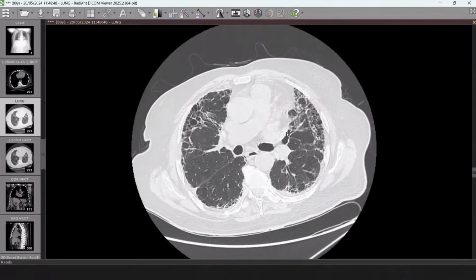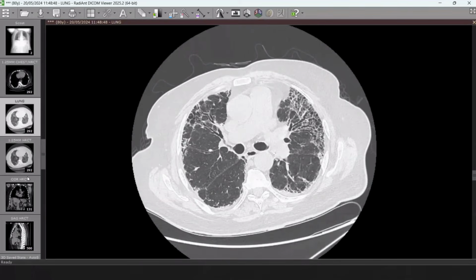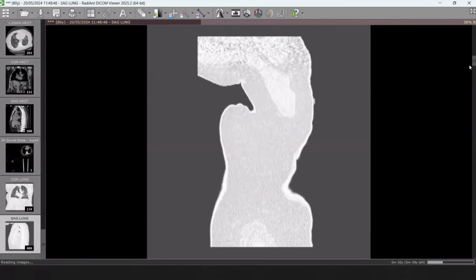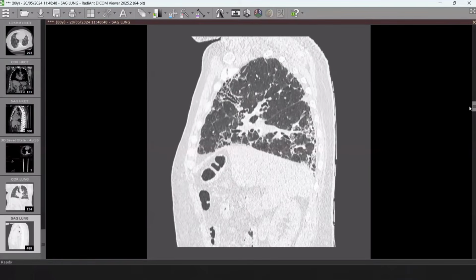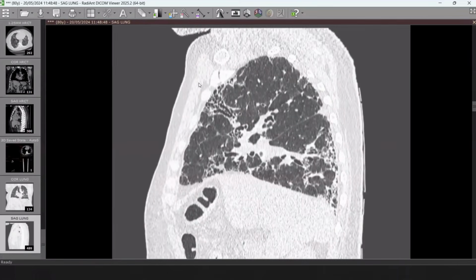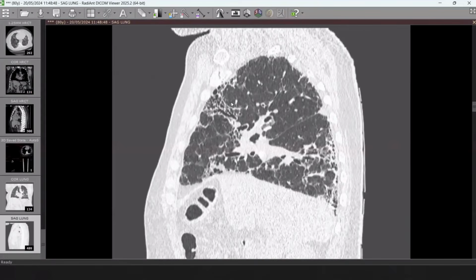So if we have cystic honeycombing more localized along the anterior aspect of the upper lung lobe, especially if we have this on both sides, this can raise the possibility of underlying connective tissue disease. But we are not sure because we don't have any additional signs, but look for this area. Can you give me the hand, please? Look for this part of the scan. This cystic honeycombing is more localized along the anterior segment of the upper lung lobe.